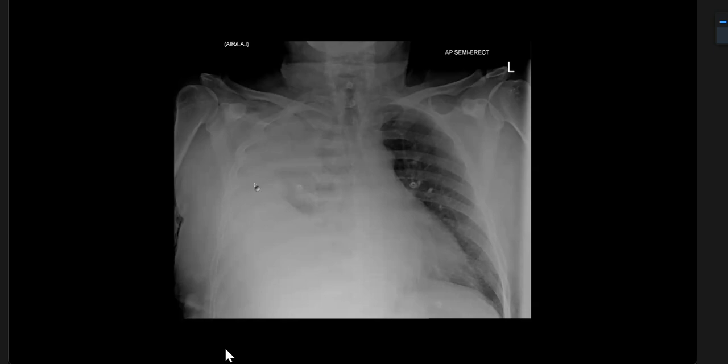Fractured rib is key here, whether the rib is fractured or not. Somebody who is in acute shortness of breath, what are the possibilities? One, trauma causing hemothorax or pneumothorax. Second, PE. Third, a large mass compromising the lung function, and suddenly the patient has reached a stage where they are exhausted. I can't think of anything else, honestly, which will give you acute shortness of breath, or pulmonary edema. So here, you can say there's no rib fracture.